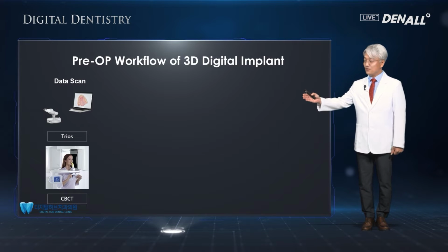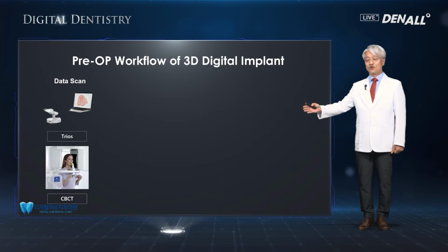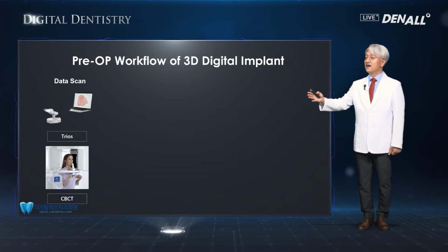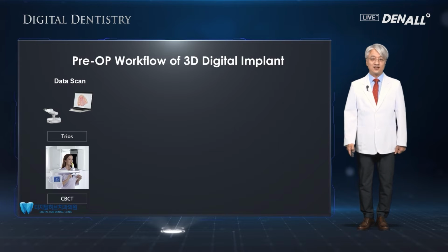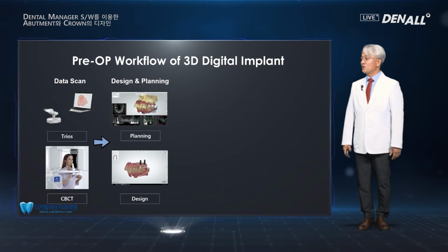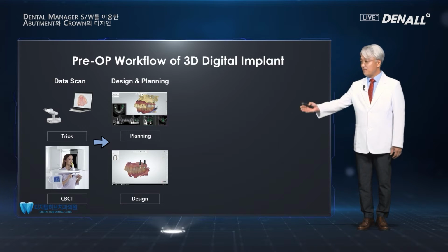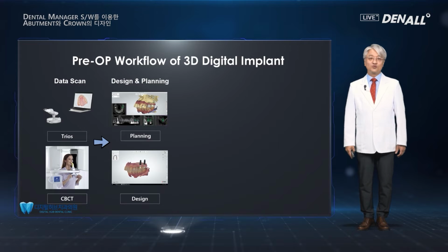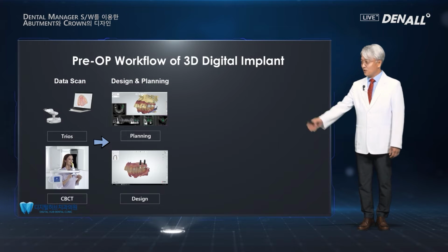As you can see here, through an oral scanner or CT, 3D data of a mouth or head and neck hard tissue is acquired. Second, with the data, designing is done with the planning software like Implant Studio of 3Shape. Using the Dental Manager, implant coordinates are designed and abutment crown designing is done.